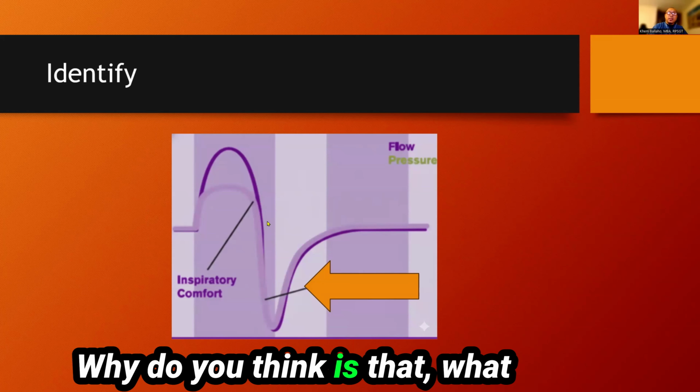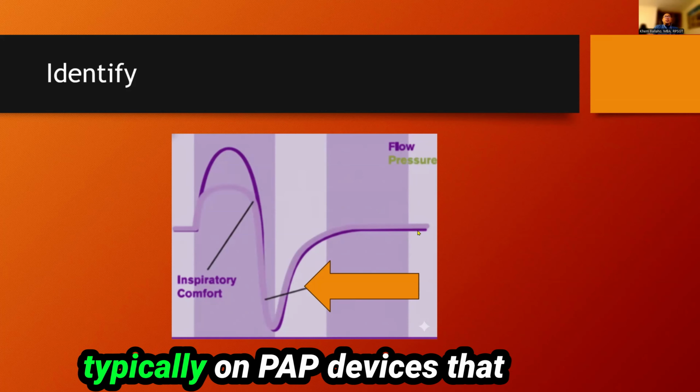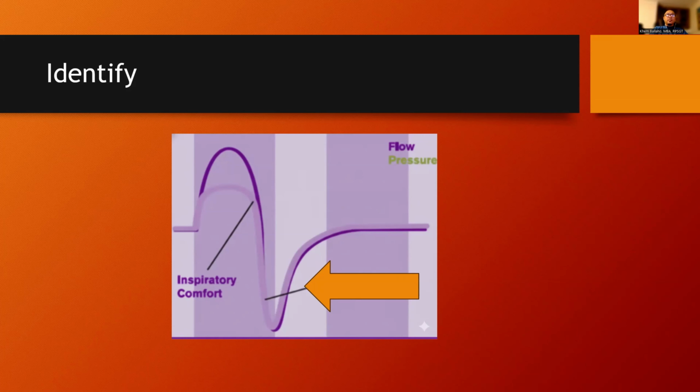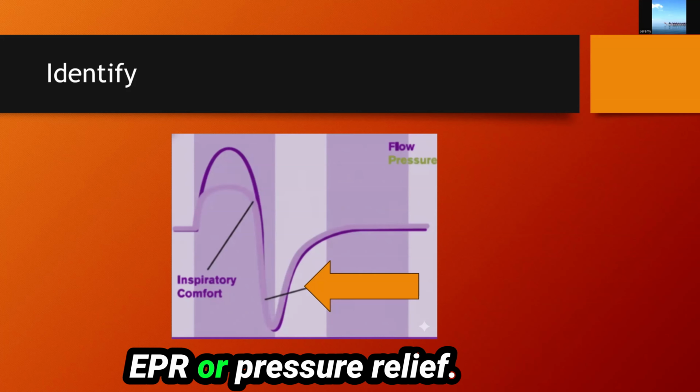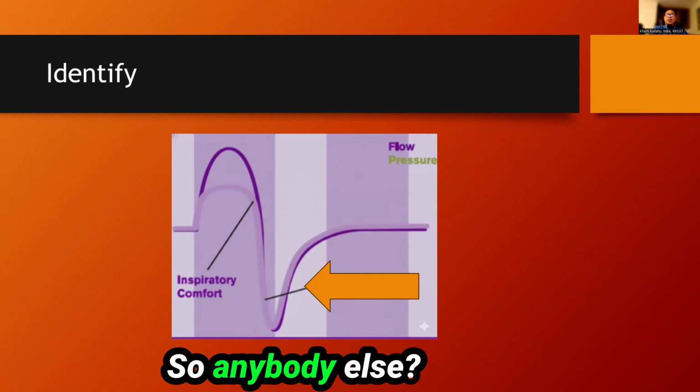Why do you think that is? What is this feature typically on PAP devices that will allow for this to happen? EPR, or pressure relief. Very good. EPR is one. Okay, so anybody else?